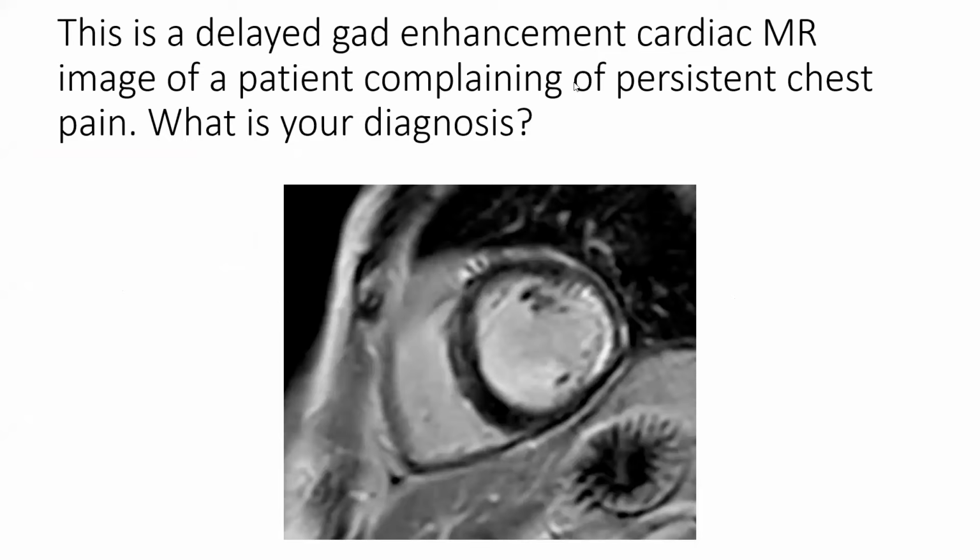Okay, the first one. Here is a delayed GAD enhancement cardiac MR of a patient complaining of persistent chest pain. What is your diagnosis? Cardiac MR is a high yield topic for board exams, for core exams. All right, so your options are myocarditis, myocardial infarction, sarcoidosis, amyloidosis.